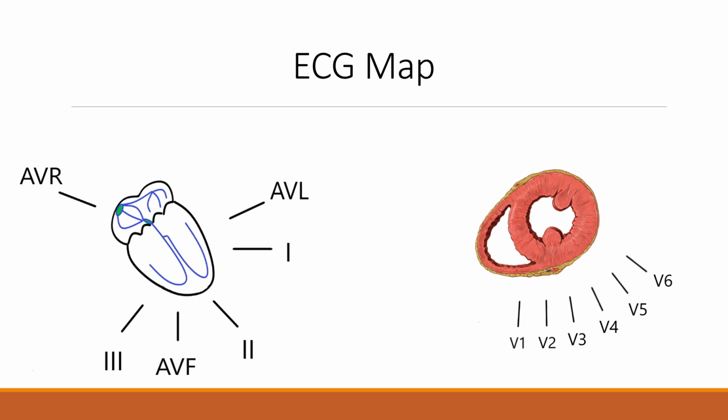And so that's important. I want to see ST elevation. Well, ideally, I guess, don't want to see ST elevation because that's bad. But if I see ST elevation in 3, then I'm looking at ST depression in AVL. And actually, as you get really good at ECG interpretation, you may have come across that if it's a true inferior STEMI, it is much more likely to have more ST depression and more reciprocal changes in AVL than in 1. And that's because AVL's viewpoint is more reciprocal to the infarction that's occurring at the bottom of the heart because it has a higher angle of view.